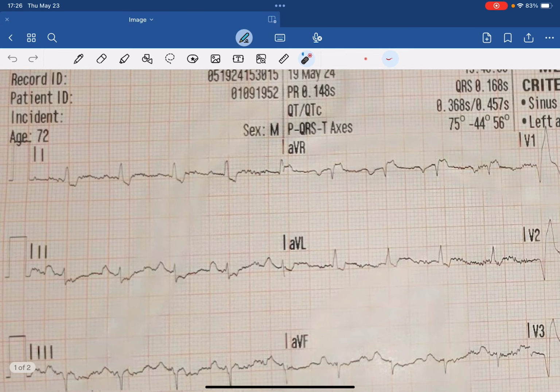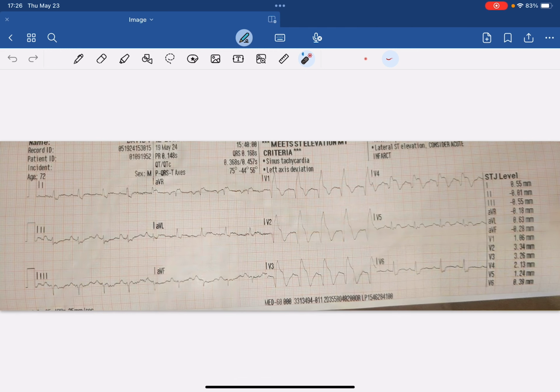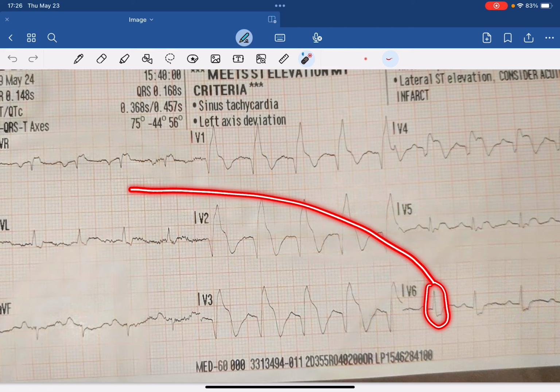So anytime you're confronted with something that looks like this and it's ambiguous, you're not really sure what starts where, it would behoove you to make sure to look in all 12 leads with the understanding that all 12 leads represent the same duration of time. And what does that mean? Well, that means that the time it takes for the QRS complex to depolarize in V6 is represented identically as the time it takes for that QRS complex to depolarize in aVR.